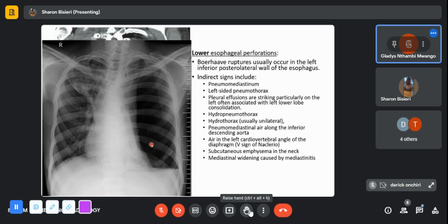It's not lung field. What else would you use? Hemithorax, isn't it? The lung is completely collapsed. You can see it against the mediastinum, that triangle that you're seeing going all the way up to the hilum. Actually, below that, there's another sharper line. Yes, that one. That's a collapsed lung. So you have air filling that hemithorax with an air-fluid level, and there's a mediastinal shift. That's important to mention because it means it's under tension. And what's happening in the right lung?